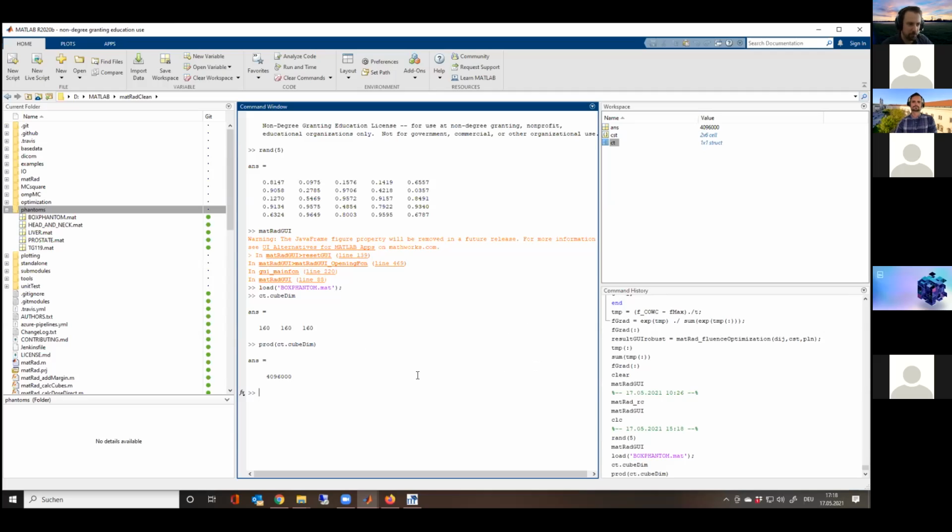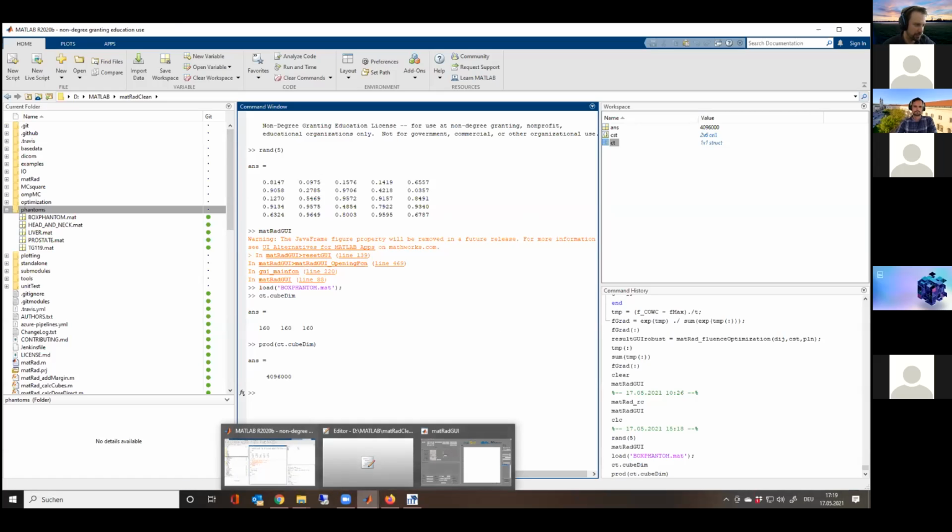So basically we calculate something and then we explore the results, explore the variables. Maybe we stop Matlab during execution and check some variables. So that's what I did here, for example. You can do some nice things, and interfere with computations in ways that you cannot do from the user interface, and you would never be able to really do from a commercial system because this interference is not really possible. You need to rely on what's implemented in the user interface or in the scripting interface, and if it is not there, you have never access to it. So that's coming back to the reasons why we chose to start with MatRad.